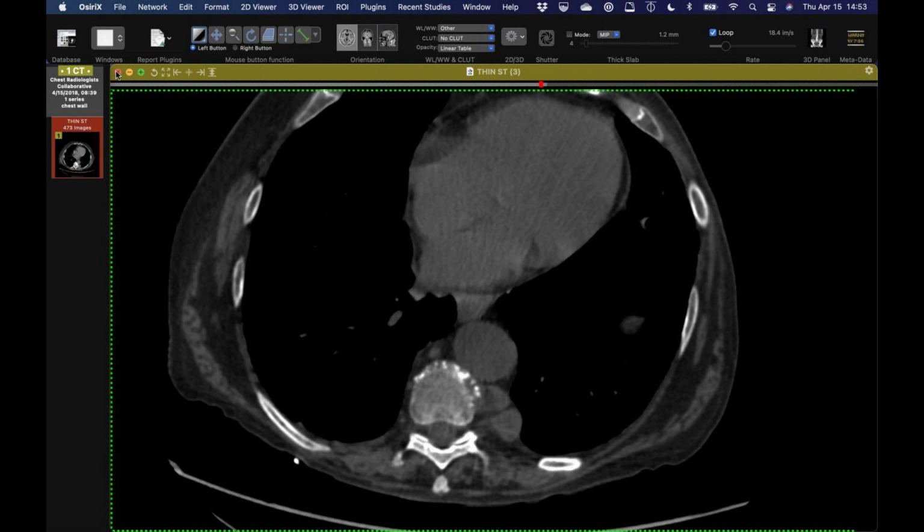So yeah, and it very well may be. I mean, they only took a core needle biopsy of it, so they didn't have the whole lesion out. So maybe a myelolipoma is a form of extramedullary hematopoiesis, since it is myeloid tissue. It looks as if there's been some modeling of that vertebral body alongside it. It's just slightly concave, right here. That just goes with chronicity. It's not destroyed, but just slightly remodeled.